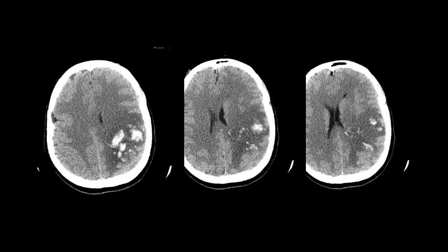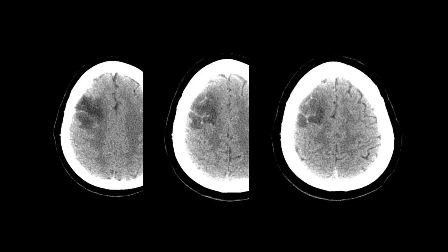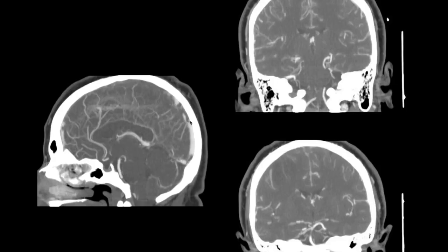And when you think of venous infarct, you also have to think of venous thrombosis and venous sinus thrombosis. And sometimes you can, so we're going to see different examples. So here's an example where you see the cortical vein thrombosis with these venous infarcts surrounding it. Not a lot of hemorrhage, but perhaps a little bit of it. Here, when you look for venous sinus thrombosis, you can do it using a CT venogram. You can do it using an MR venogram. Sometimes also just plain 3D T1 post-contrast images do also a great job at detecting those venous sinus thromboses.